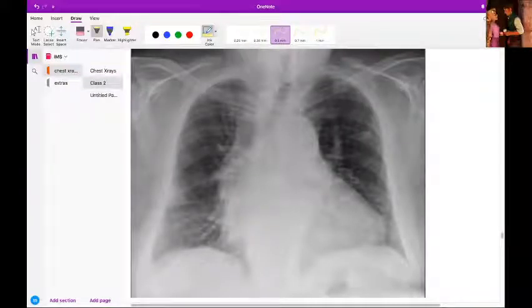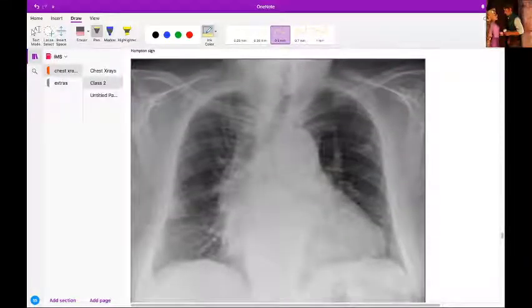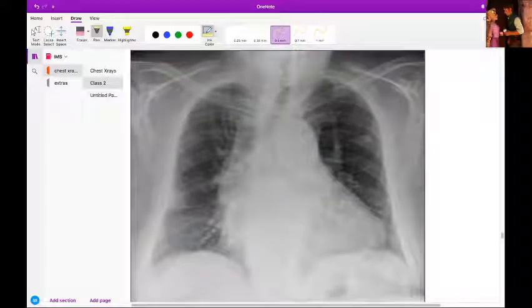Okay. But suppose if we do not suspect, and we're just doing chest X-ray, what are the signs that we'll see that indicate pulmonary embolism? Okay, so one, and this is rare, I don't think it's that important, but anyways, there's this thing called Hampton Hump sign.